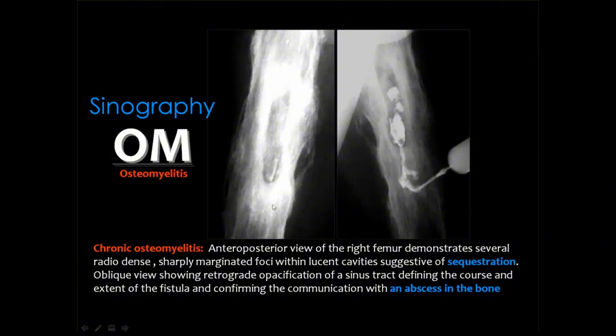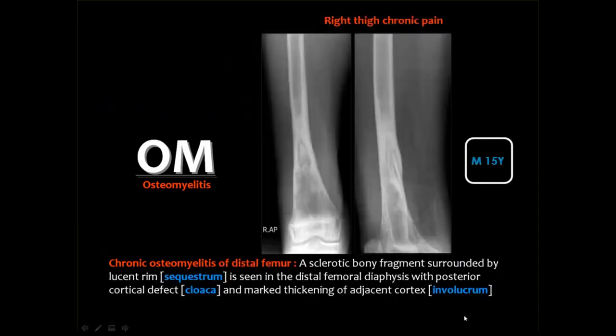And sometimes these openings are persistently discharging inflammatory fluid or even pus, and you may need to perform this technique, which is known as sinography, in order to delineate the track where it is connected to inside the bone, in the medullary bone, where an abscess cavity is opacified.